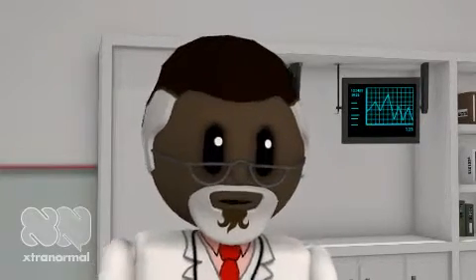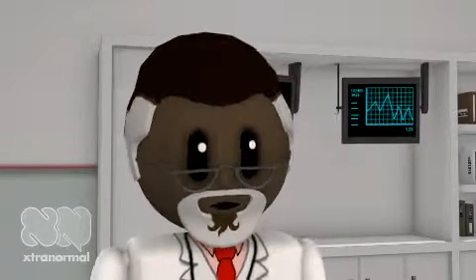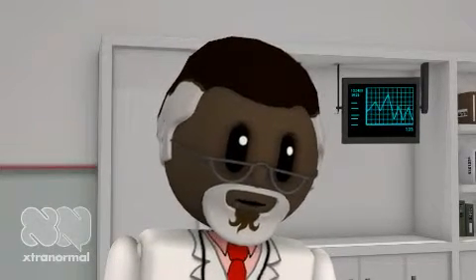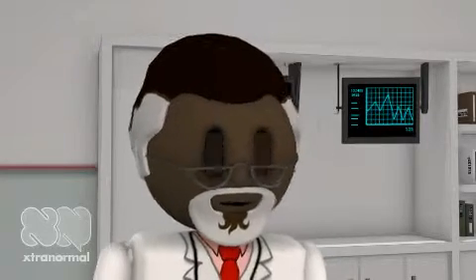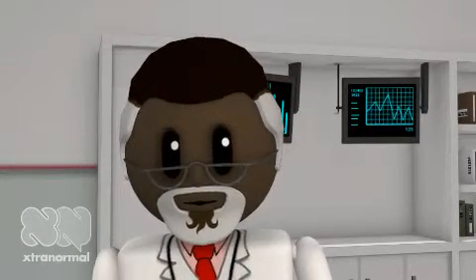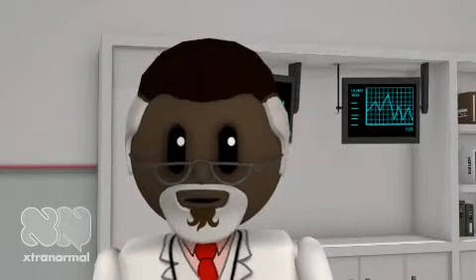Volume targeted assist ventilation with a constant flow. Flow volume loop is similar to the control mode loop. Pressure volume loop illustrates patient triggering. The loop begins at zero, and when the loop moves to the left of the volume axis, this indicates an inspiratory effort was made by the patient. Volume targeted SIMV flow volume loop shows two types of breaths. The smaller, inner loop represents the spontaneous breath whereas the larger loop represents a mechanical breath.